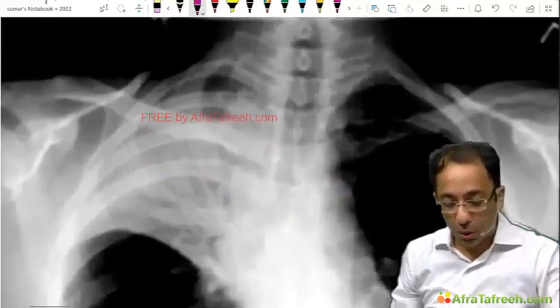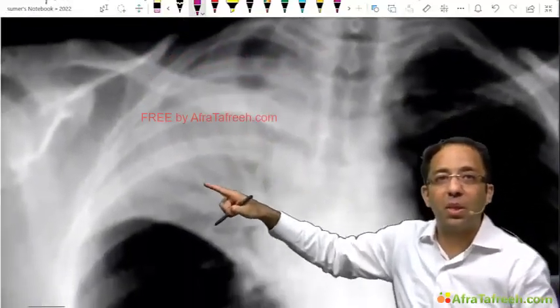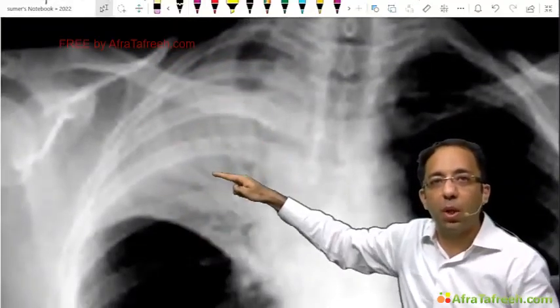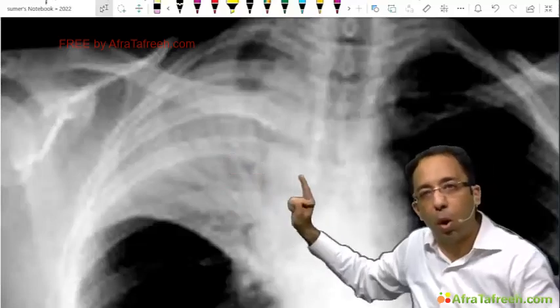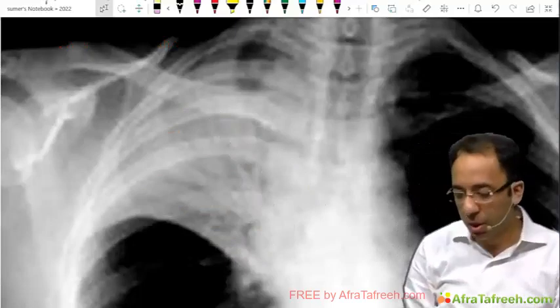Okay, so this is the air bronchogram that I was talking about, Manushi, Supriya, that you can see within the opacity. You are able to see some tubular bronchi because the bronchus is open, while the alveoli have become opaque because of a pathology.